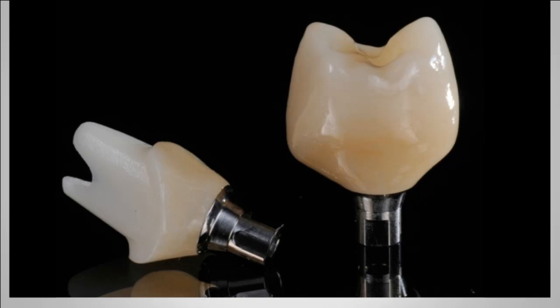And for those that have CEREC, you realize that there are so many materials from which we can pick to restore an implant. On the right is a monolithic hybrid abutment crown. It is a screw retained crown that was also designed and milled with the CEREC system. But in order to do this hybrid abutment milled crown, there's only a few number of blocks that are available for the CEREC system that have a pre-machined hole. And I'll get into the details here in just a moment. Both of these materials that you see here for the abutment and for the crown are lithium disilicate, which is EMAX, available from Ivoclar.